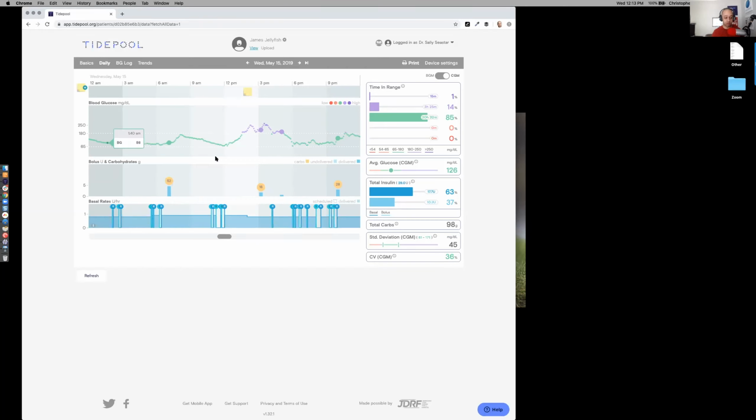The line represents your CGM values. You can hover over this entire line to see the different timestamps and CGM values based off of what your Dexcom or your Medtronic sensor or your Freestyle Libre are reading. Larger dots indicate either manual blood glucose readings, or in the case of blood glucose meter, we've changed the source here to meter, and that would be where you're seeing those values then and there.